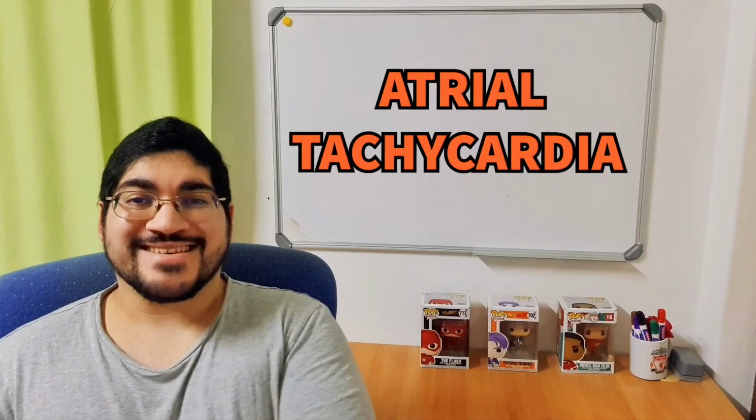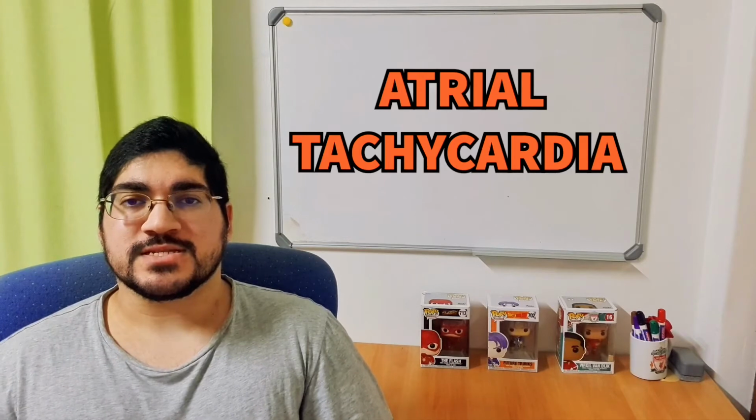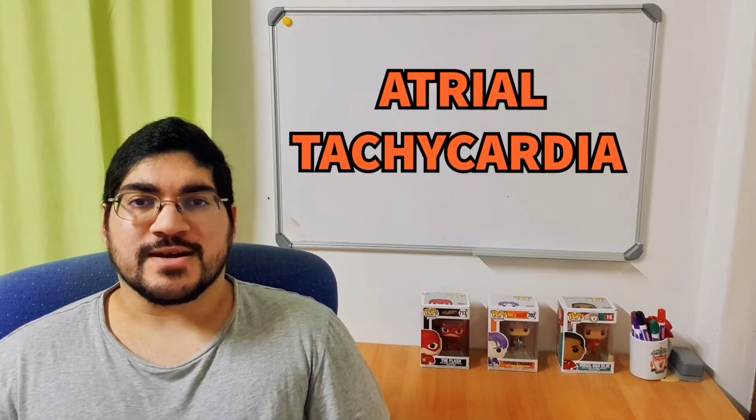And the last one is atrial tachycardia. That's just a tachycardia being generated somewhere in the atria. So you'll see a P wave that looks kind of strange, but what exactly that P wave looks like will be determined by where in the atria the impulse is being generated. Could be anywhere in the atria.